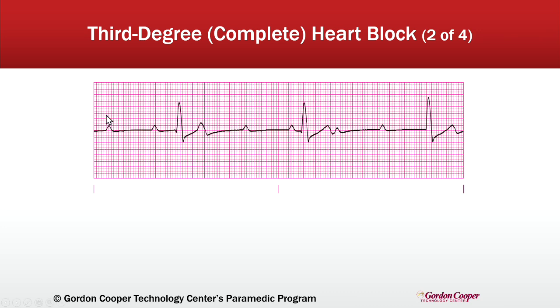So let's go ahead and get down here. Right off the bat, we've got a missed beat, so we know we're dealing with a block here. Now, what we were talking about, we see these P waves. There's going to be a P wave in here, and then you see it keep going quite regular. When we look at these ventricles, we see that they're quite regular. However, these guys aren't connected. They're not talking to each other.